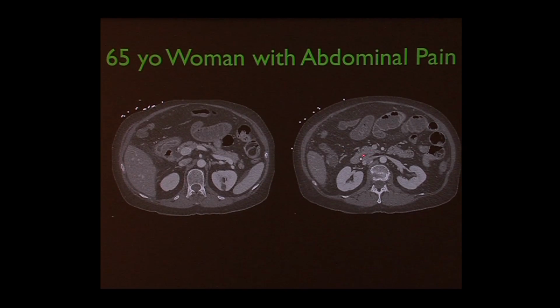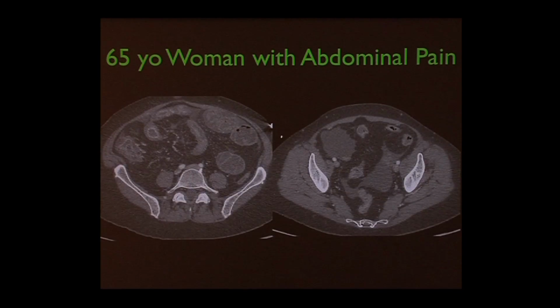Actually, there's the stone there with the kidneys. Here, this is the left renal vein coming across to join the inferior vena cava, where the vein drains into and then it goes up to the heart. This is the aorta where the blood goes down from the heart. We used IV contrast in her, so the aorta is enhanced and the kidneys are enhanced, et cetera. And here, lower down in her abdomen, she has more of this thick-walled bowel with enhancing mucosa, the inner lining of the bowel, with fluid centrally. But this is all abnormal.